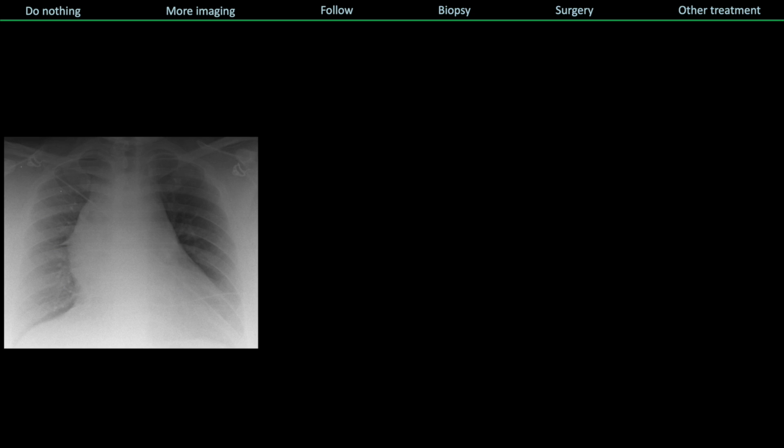All right, third type of lesion shown here. Patient, a pretty large patient who has what looks like a wide mediastinum. I mean, that's the best way to put it. And that mediastinum goes way down. And again, we can see the hilar vessels through this widening. So we're concerned that there's a mediastinal mass here.